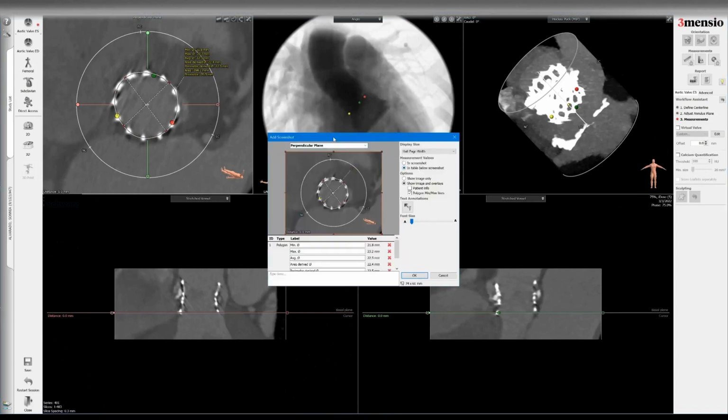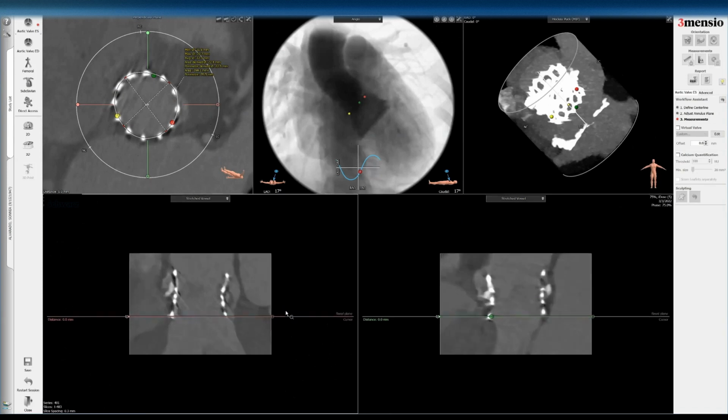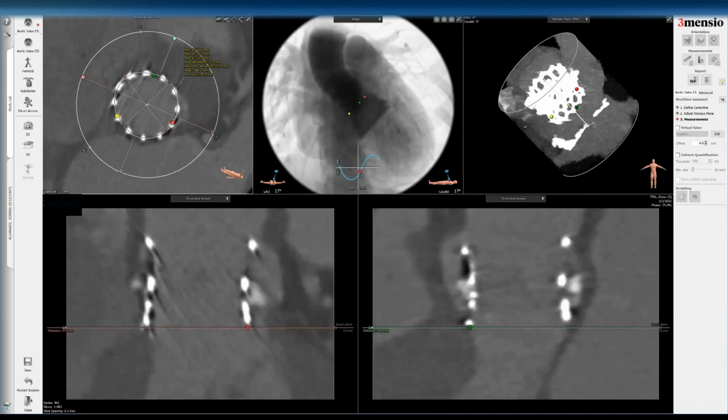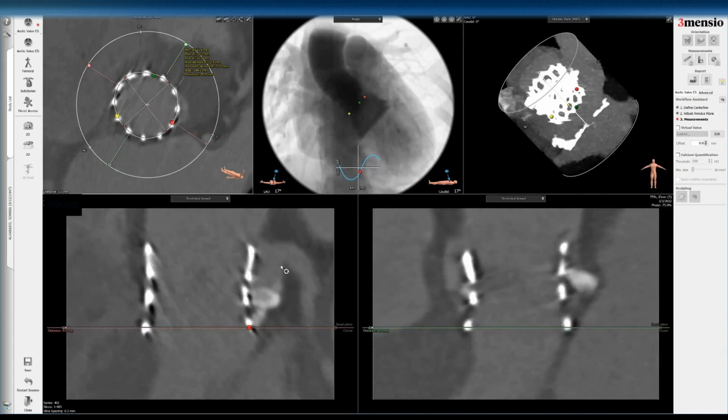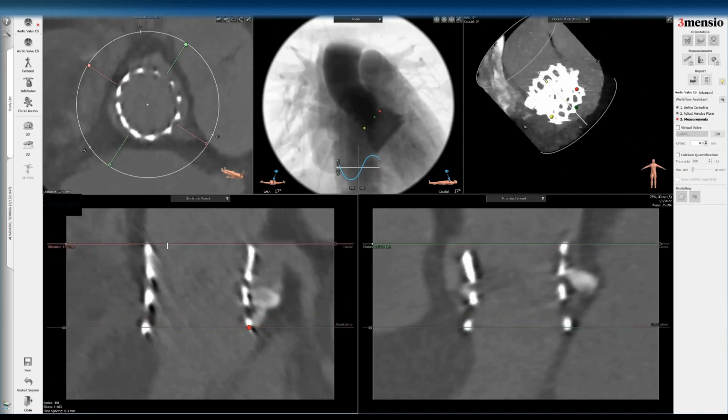So I'm going to save this 23 S3 inflow. Okay, and then I'm also going to try to crop these to set up my left main and right coronary view here as well. So I want to see where my right coronary sits. You can see that here. And then I'm going to go next to the outflow. So the outflow is right around there where the crown disappears.